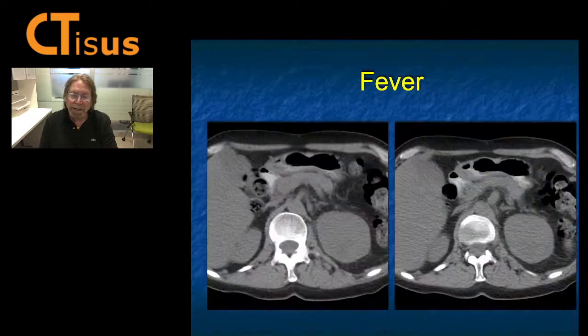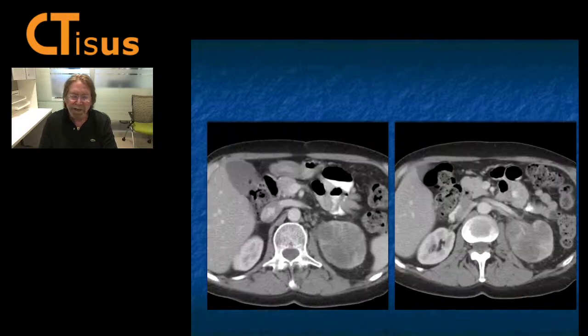So looking at that case, what's going on in the left kidney? It's non-contrast, but is there something going on? And surely the answer is yes with contrast. There's something infiltrating. Now you can say infection, infarction, but you also should maybe throw in, if you looked at the whole kidney, you would be able to do more.